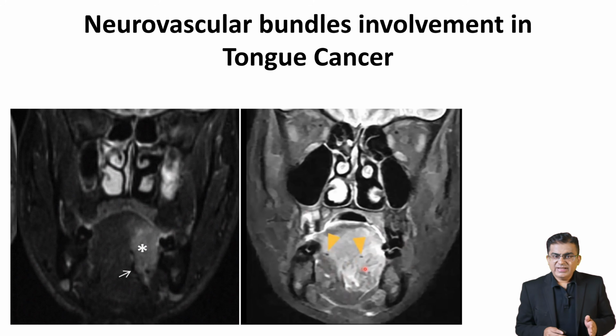This image shows a very large tongue lesion involving both lingual arteries. This specific level of anatomical detail is exactly why you must order an MRI, not a standard CT. MRI clearly shows us this critical arterial landmark and the soft tissues of the sublingual space.